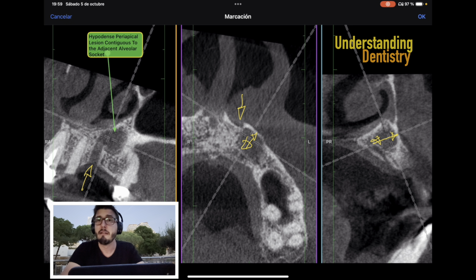Again, treatment for the endoperiodontal lesion: that tooth needs to be extracted, and then everything curetted, the cyst enucleated if possible, then irrigation with saline solution, very careful because there is a risk of paresthesia. But that's basically the treatment. And then rehabilitate the patient. But we are not discussing all the rehabilitation. We need to check the occlusion. We don't know the vertical dimension. We don't know how is the occlusion of the patient because we are analyzing a CBCT. But this is the part of decision making involving the CBCT.